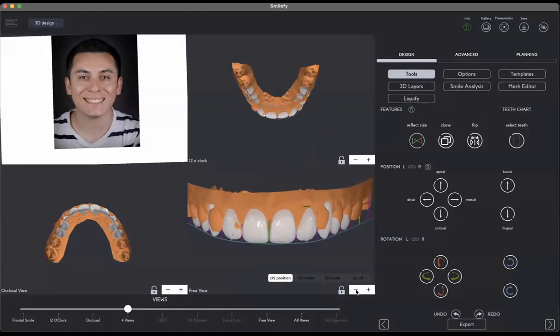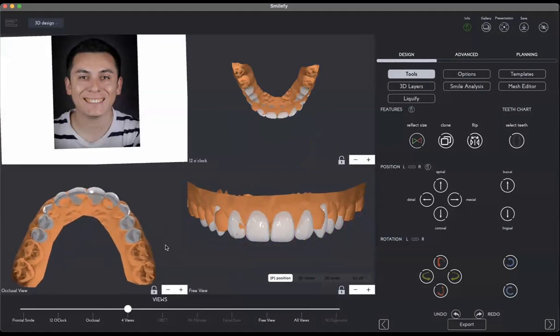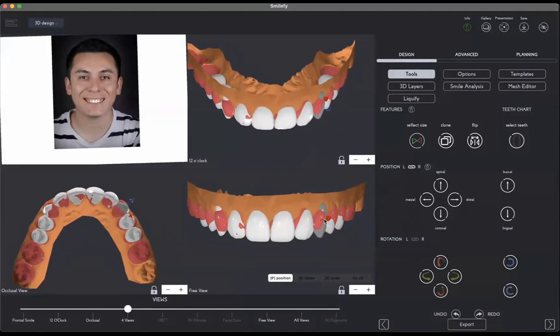Also, very important, every single feature that you see on my Mac is working on iPad and on iPhone, because for the heavy calculations, and it's really important, we split the calculation between the device and the cloud. So you get from the cloud the heavy calculations, the coordinates, everything you need for the smile design. So you can even design 3D on your iPhone automatically and then create the mockup, right?